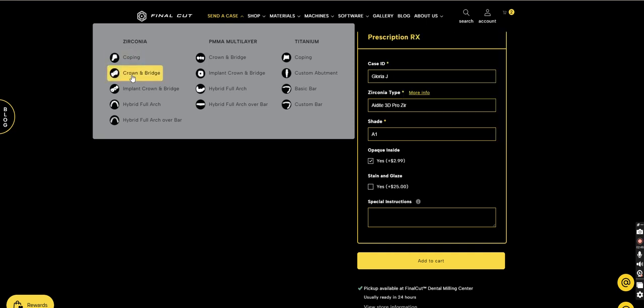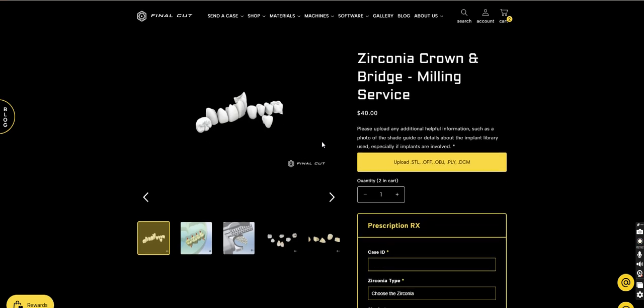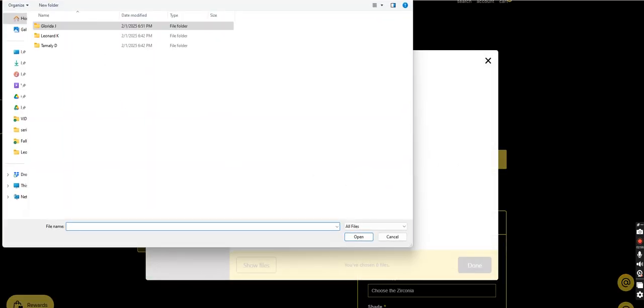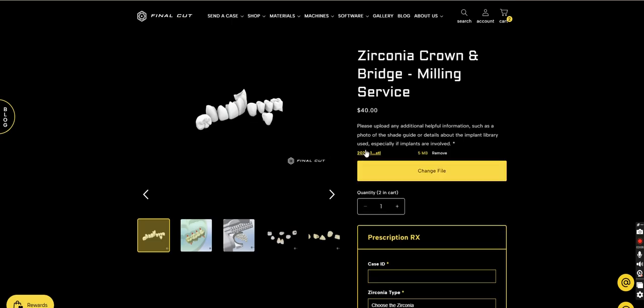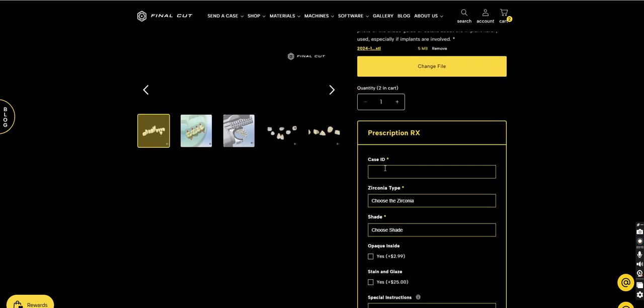I can go to zirconia, crown and bridge, choose the same type of service, upload, choose a local file, select the patient folder, Leonard K, select the file that I want to upload, open, add. I just uploaded one single crown, so the quantity is 1.